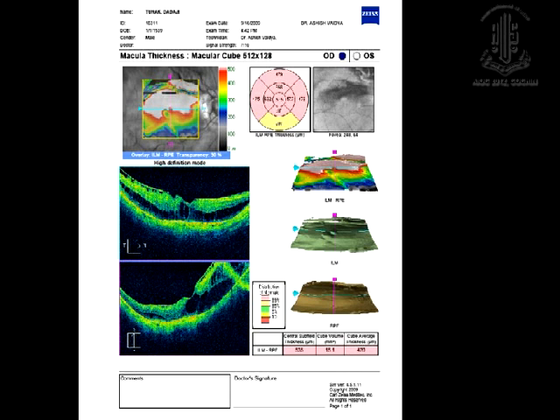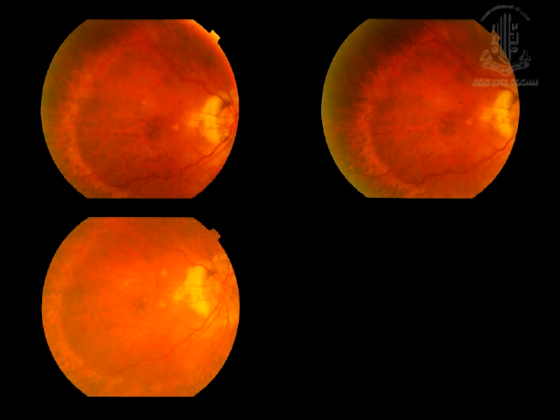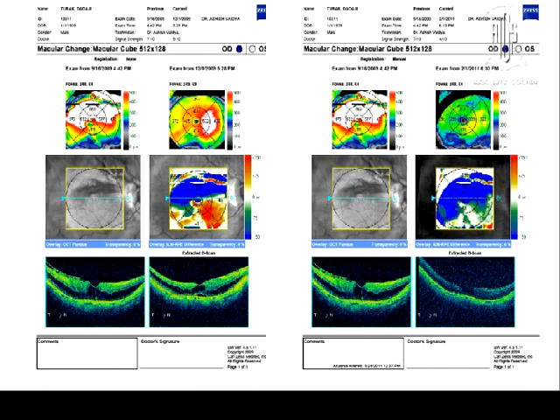These patients have a reduced vision. When you observe the OCT very closely, you have this thin membrane over here which is giving rise to traction and giving rise to increase in the thickness of this retina. We do a surgery and remove this membrane, and these are the color pictures which don't show any difference. But if you see this OCT, in the period of 1 month it has reduced. The patient went to his village and came back to us 6 months later. And 6 months later, you can see that this retina had almost completely flattened out with the patient's vision improving.